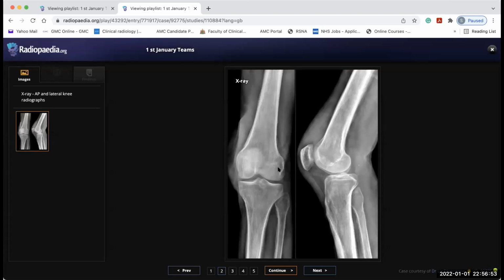So this might be a thyroid acropathy as well. Yeah, in thyroid acropathy also we'll see this kind of edematous changes. The third differential is hypertrophic osteoarthropathy. Yeah, okay, so this is actually a case of hypertrophic osteoarthropathy. We have the primary hypertrophic osteoarthropathy and the secondary hypertrophic osteoarthropathy. So what are the causes which can result in the secondary?